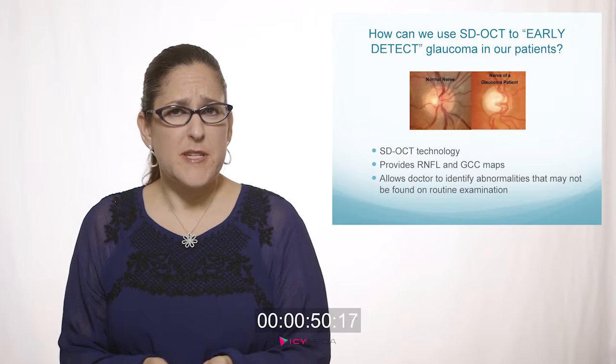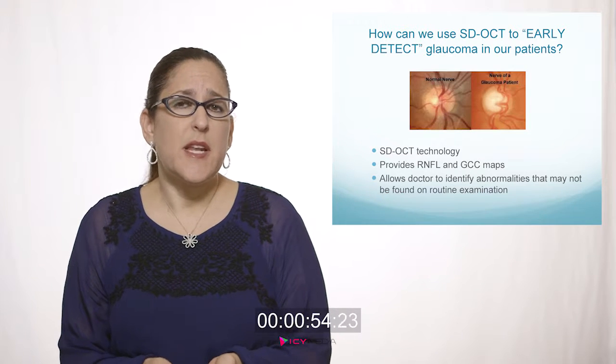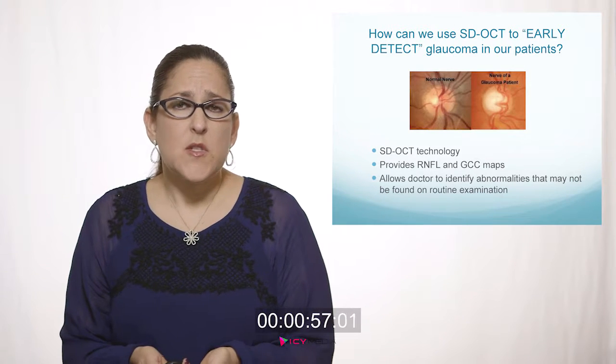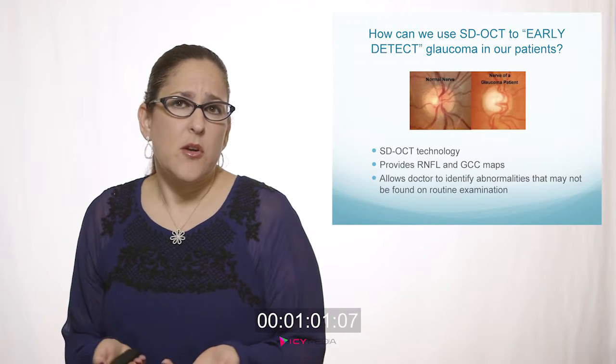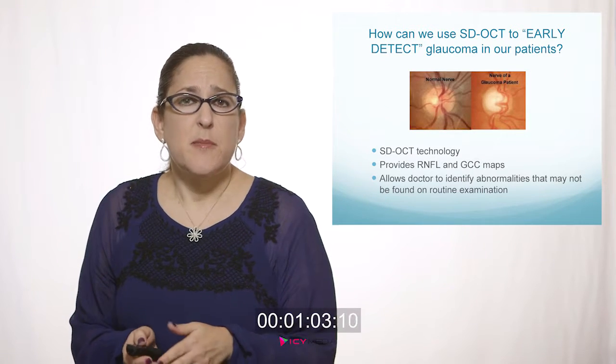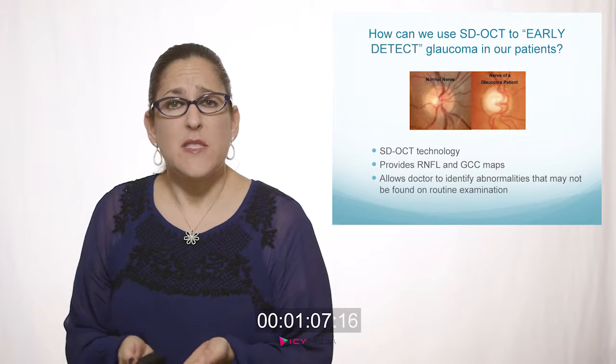So this particular presentation is going to talk about glaucoma. How can we use SD-OCT in the management and diagnosis of glaucoma? So really the question is, what does the OCT provide for us that we wouldn't get on a normal examination? The OCT provides excellent information about the retinal nerve fiber layer and also the ganglion cell complex.